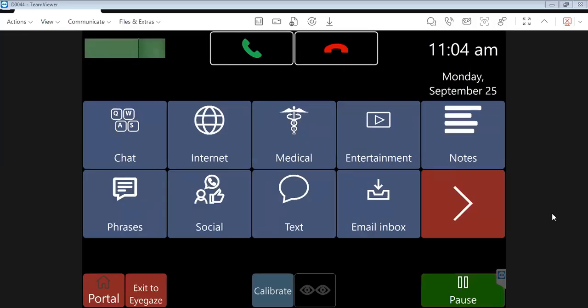This video will talk a little bit about message banking and voice banking on the Eyegaze Edge platform. So the most common question we get asked is, if somebody has banked their voice already, can it be used on the Eyegaze Edge? And the answer is yes.